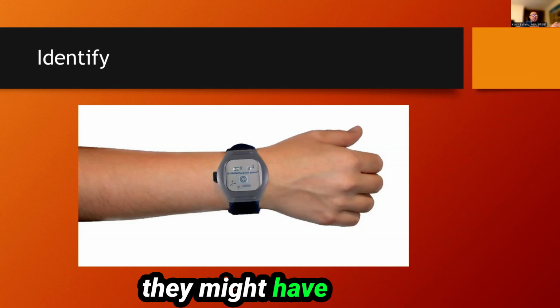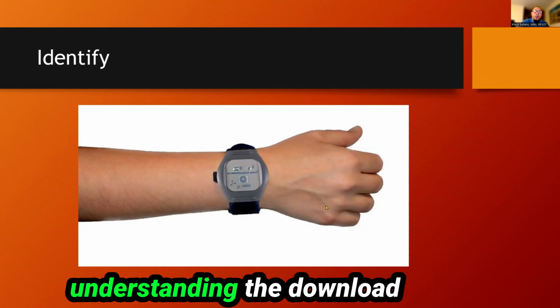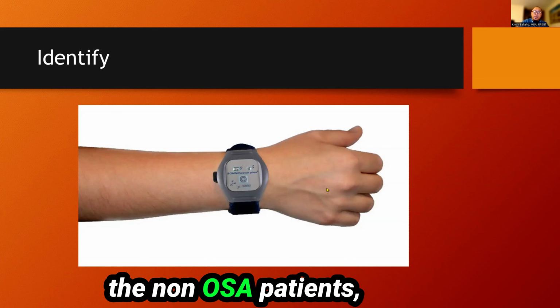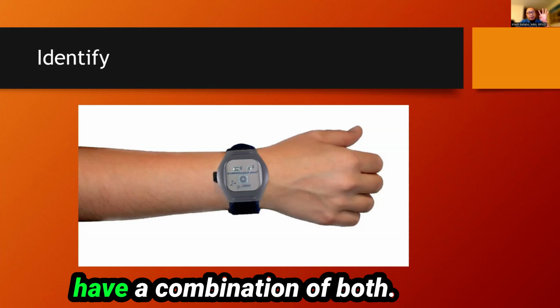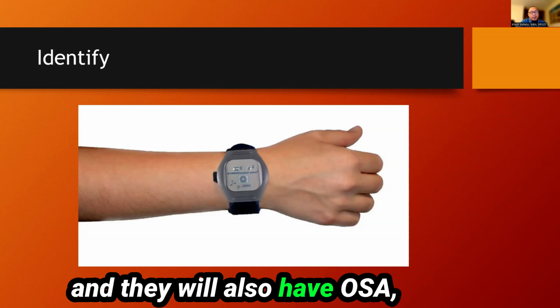They might have delayed phase syndrome or early phase syndrome. It helps a lot just understanding the download and the sleep log for the non-OSA patients. However, even when I mention non-OSA, some patients actually have a combination of both. They will have insomnia and they will also have OSA.